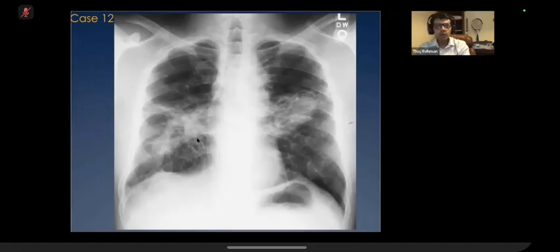And there is so much chronic scarring process going on. I wouldn't think of an acute abnormality like PCP pneumonia or invasive aspergillosis at this stage. Although you can mention that, but this is not the appearance of. I'll show you pictures of how the invasive aspergillosis cavities will look like. So this is chronic cavities, a lot of chronic scarring, and there are fungal balls in the cavities.